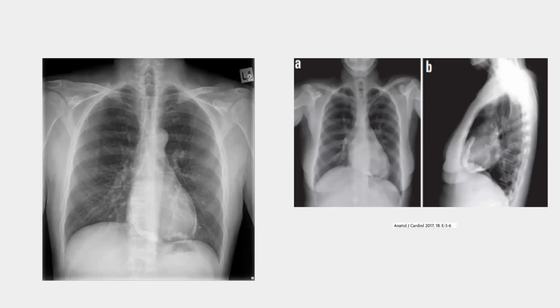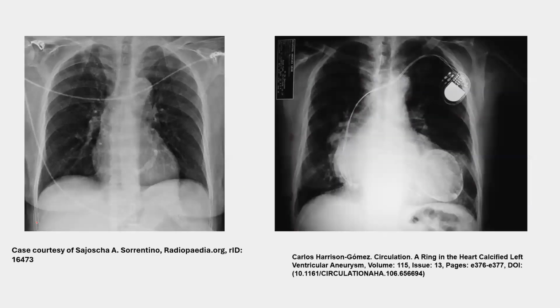And this is all pericardial calcification, and here also pericardial calcification, and this is the lateral X-ray showing pericardial calcification. And by the way, lateral X-ray is better than AP or PA orientation in depicting and discerning calcification. Okay? Lateral is better than this one. In the lateral, you see pericardial calcification better. If you look here, this is also pericardial calcification. Is it also pericardial calcification here? This one.